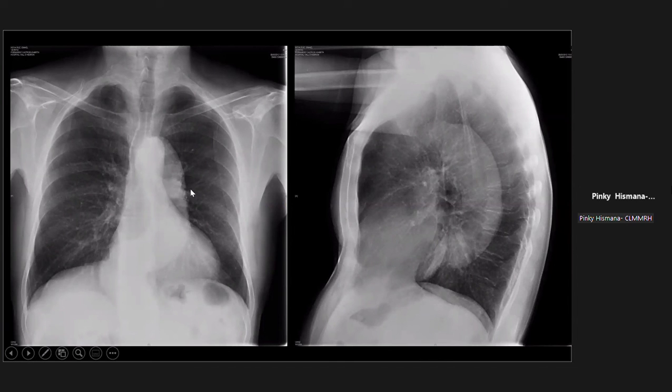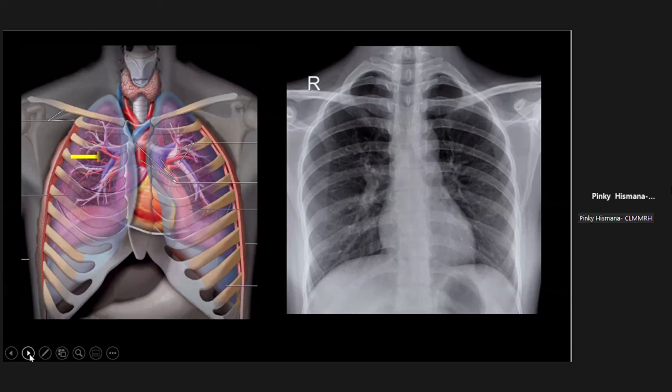So if you have superior mediastinum widening, usually the radiologist or you as clinicians later on, please do request for a lateral view so that we would be able to further come up with a closer diagnosis. So whether it be vascular or a mass lesion, we would be able to somehow better delineate or adequately assess it if we do a lateral view. So this actually represents. Now let's proceed now to the hilum.